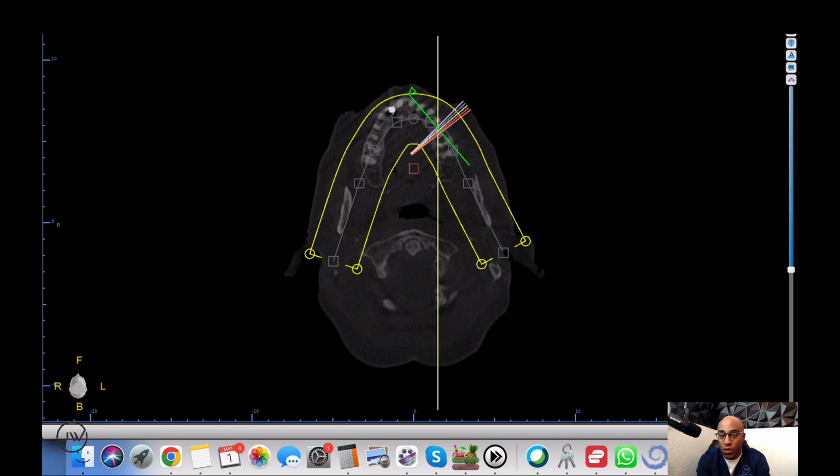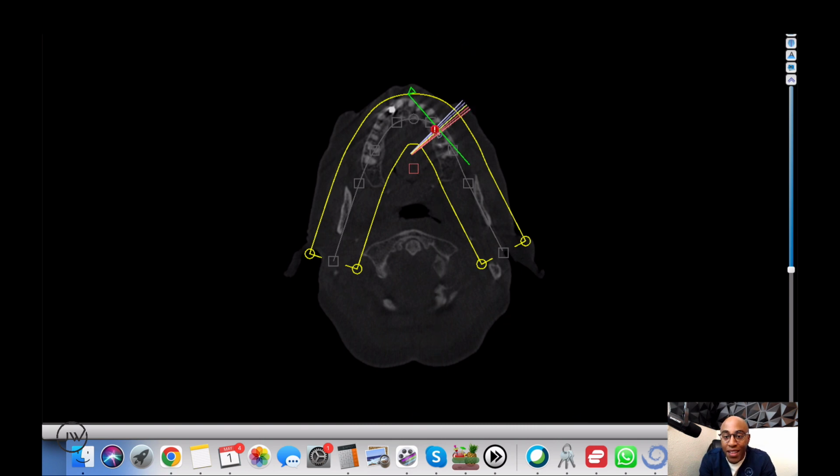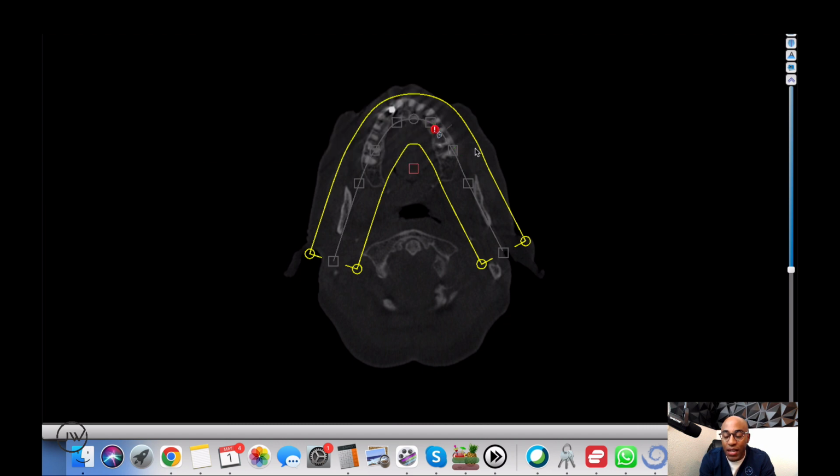And what I'm gonna do is pause the video for a second and remove this, and I'll show you how to do it. All right, now that I figured it out, you go to view. I don't use this too frequently, but go to view. We'll turn it off and on, I should say. You go to view and go to cross section projection and click that button, and now it's gone.